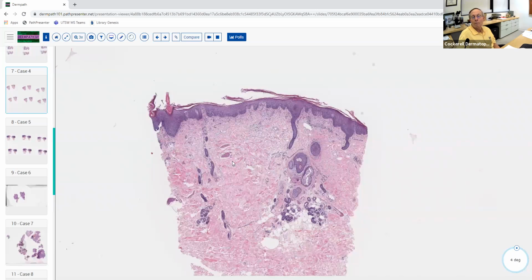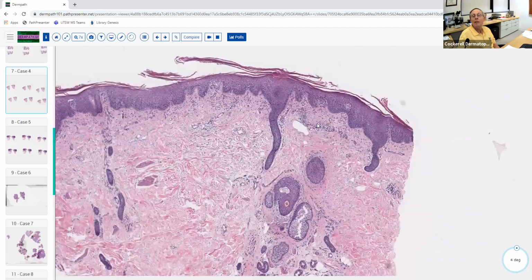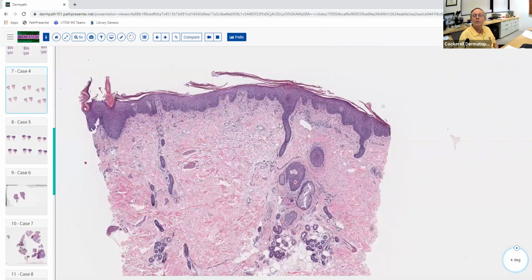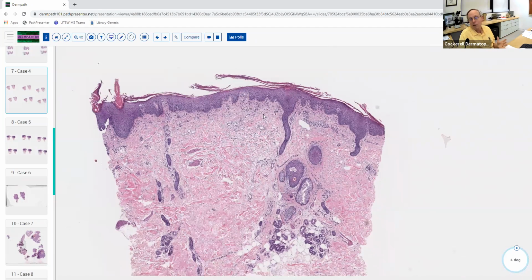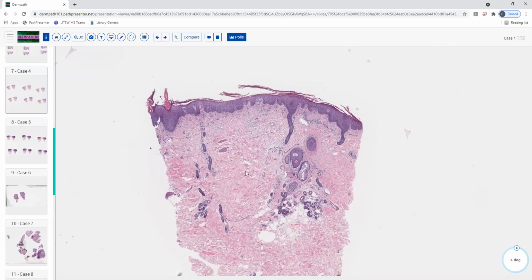So when we look at that, once we decide that and say, okay, what kind of inflammatory cells are in here? You can probably tell mostly going to be lymphocytes, we would imagine. So we're going to higher magnification, and sure enough, they are. So it's pretty non-specific. So then we say, well, where else are we going to look? Obviously, they didn't take this biopsy just for fun. They think that the patient's got some disease going on here. So we got to decide, where is the pathology here? It's certainly not in the fat this time, not much in the dermis this time. So where do we think the pathology might be this time? Is it in the epidermis?